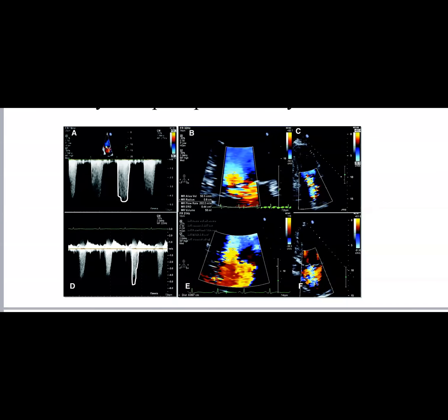Because it's most likely a late systolic jet. Yes, exactly. Because it's not. It may be eccentric. Exactly. This is one thing. It may be eccentric in prolapse. Yes, very nice. So the eccentricity of the jet gets us into the Coanda effect, which might underestimate the severity. This is one thing. The other thing is that it's not holosystolic. Yes, it is mid and late.